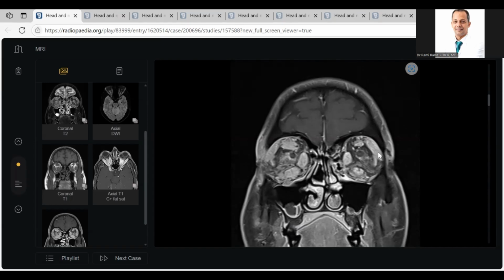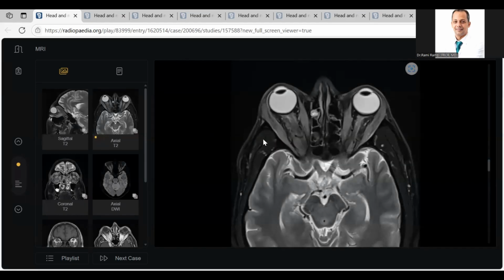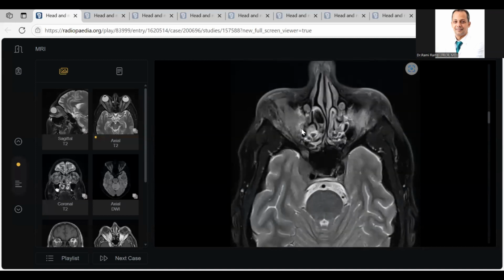Thank you, doctor. Really, you are amazing, because this case is very tricky. Why? From the first look, there is diffuse bilateral enlargement of the muscles, and there is some Coca-Cola sign, really. But the doctor takes the examination collectively.